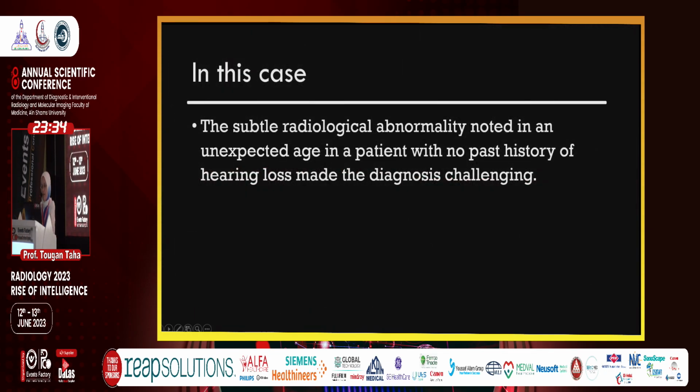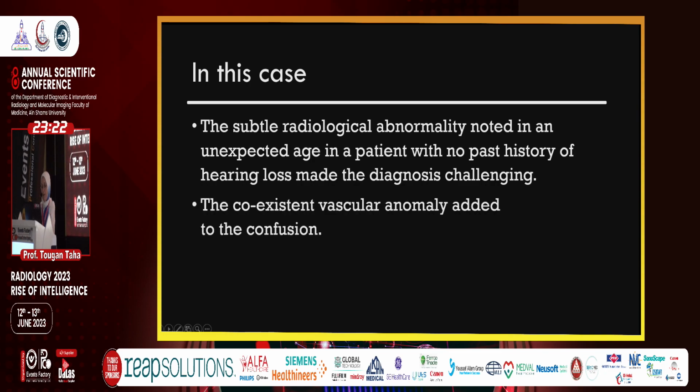In this case, the subtle radiological abnormality noted at an unexpected age in a patient with no past history of hearing loss made the diagnosis challenging. The coexistent vascular anomaly added to the confusion.